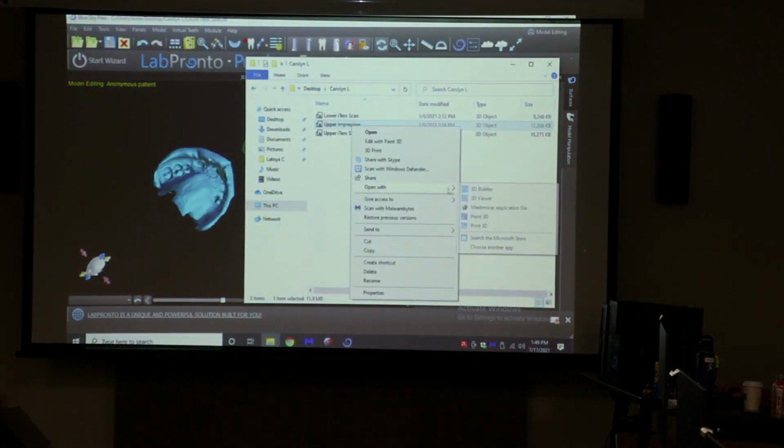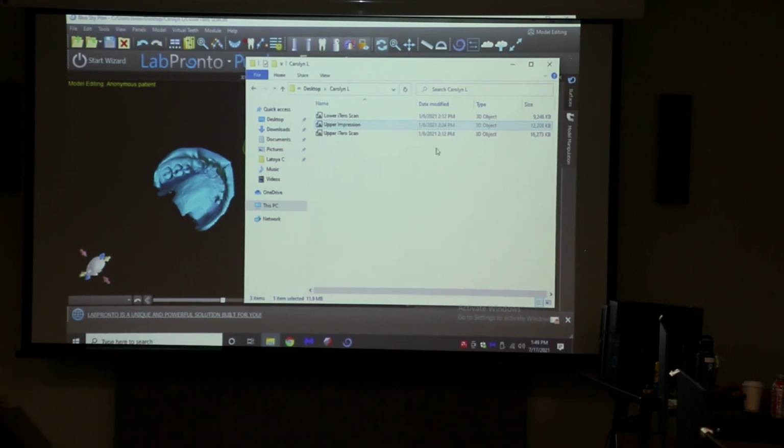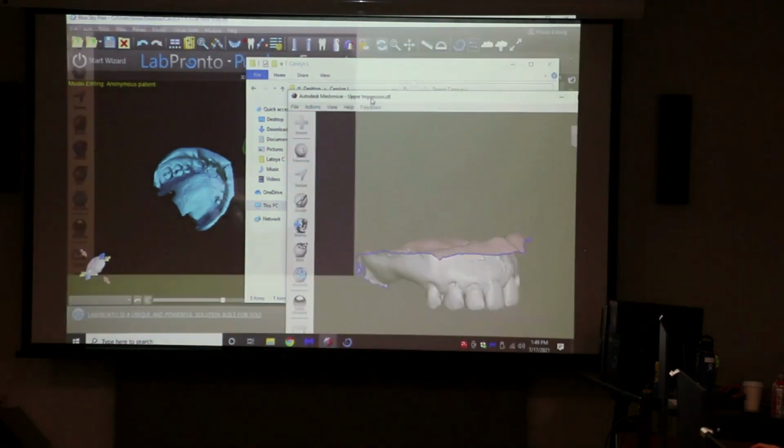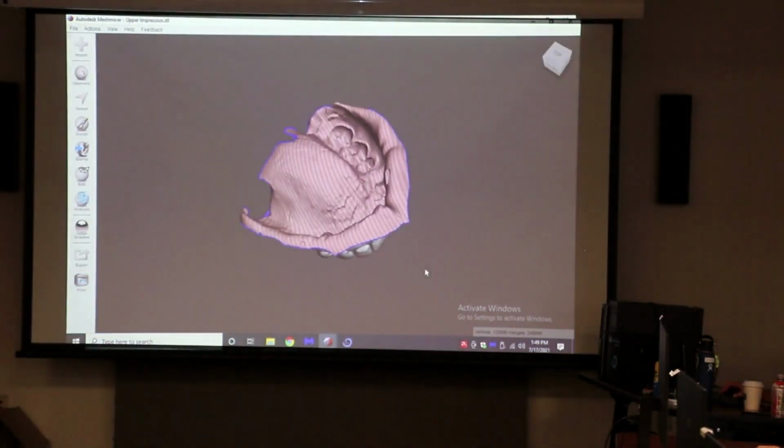That's what we normally get. We can't see the other side, so it's just odd to look at the other side. For me, it was confusing to think, wait a minute, that's an impression. Because you never see it like that. You always see a tray over it.